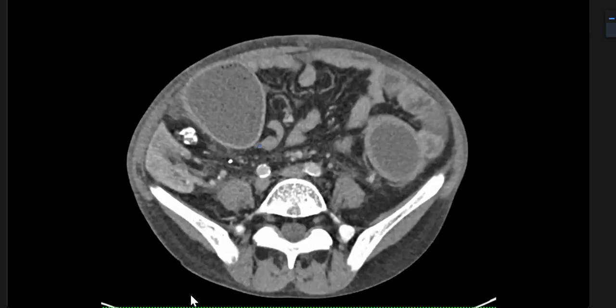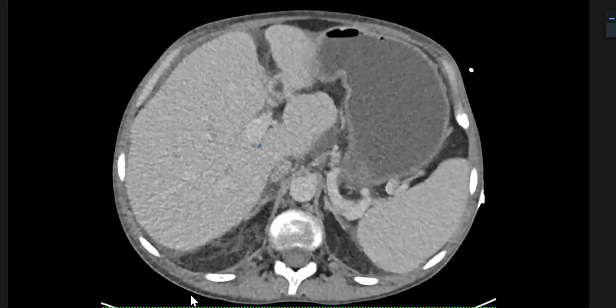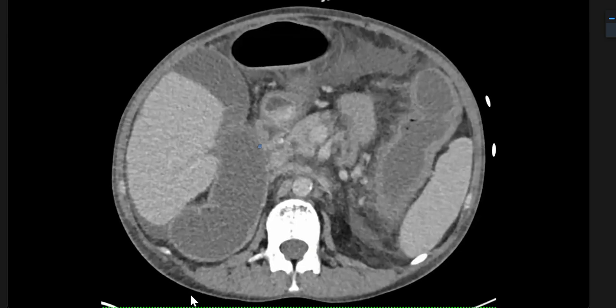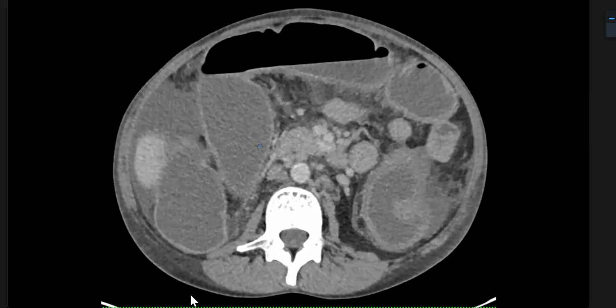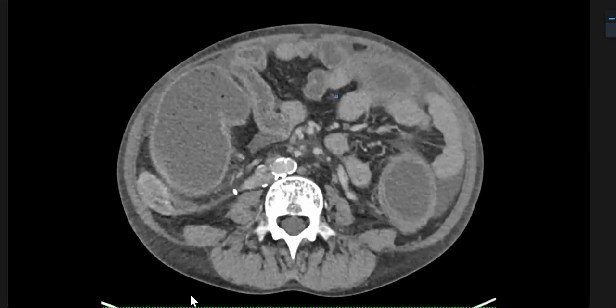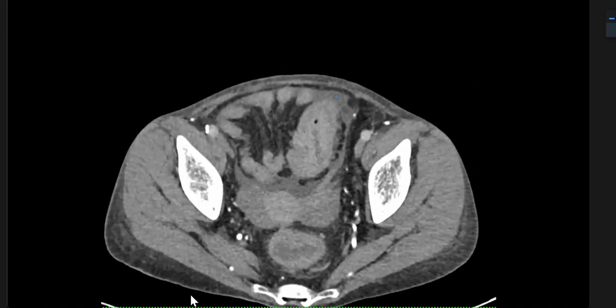So that's story number one. We have diagnosed pancolitis, with a degree of probably toxic megacolon. With pancolitis, you've got mesenteric congestion, free fluid in the abdomen, and then intussusception. Enough reasons to call surgeons acutely.